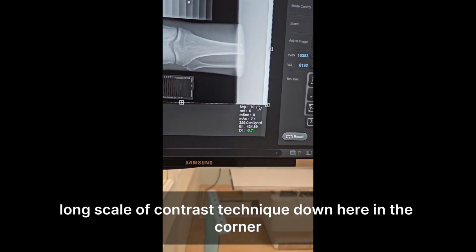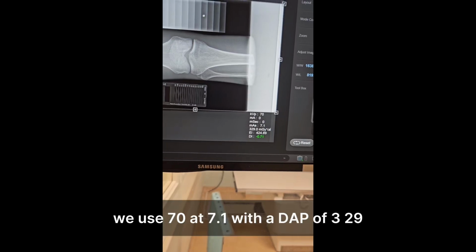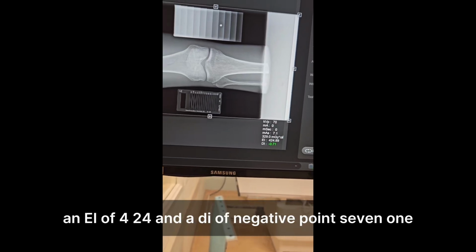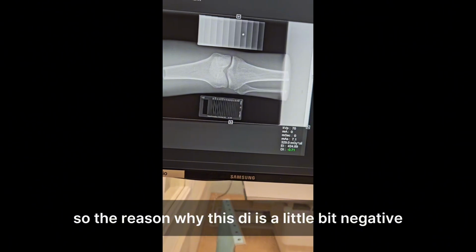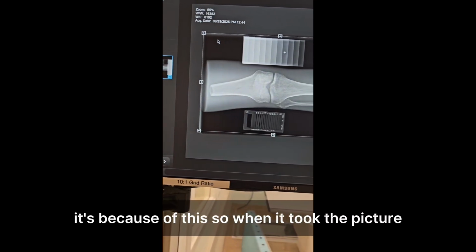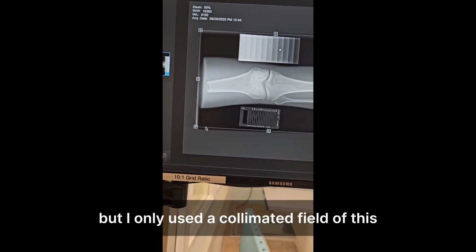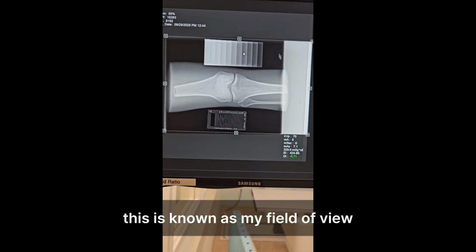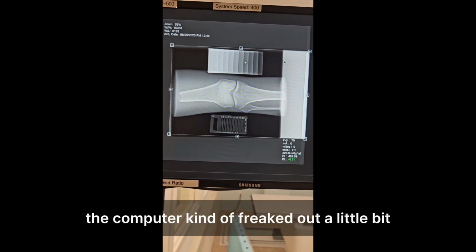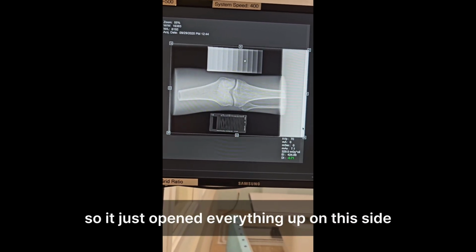Technique down here in the corner, we used 70 at 7.1 with a DAP of 329, an EI of 424, and a DI of negative 0.71. The reason this DI is a little bit negative is because of this. When it took the picture, this is my entire cassette, but I only used a collimated field of this. This is known as my field of view. When I took the picture, the computer kind of freaked out because it couldn't find where this collimated border is, so it just opened everything up on this side.